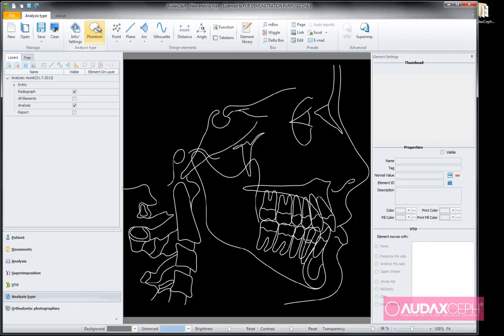Now I'm going to add a point here, which is called Sella Turcica, and here is given a name.